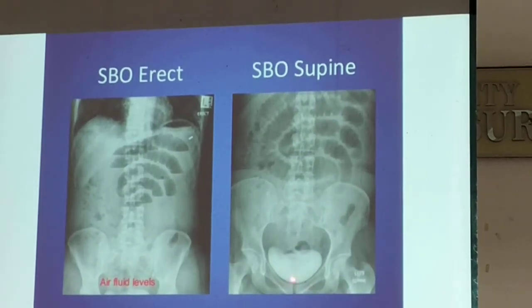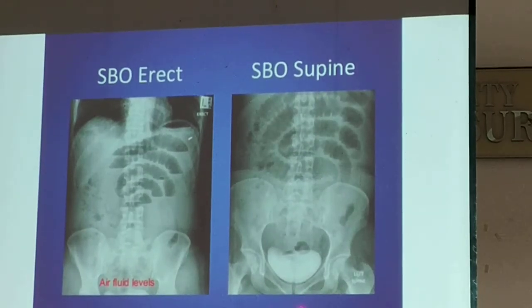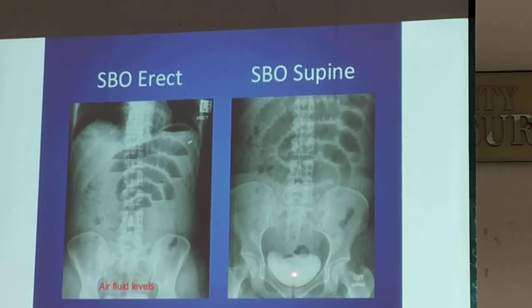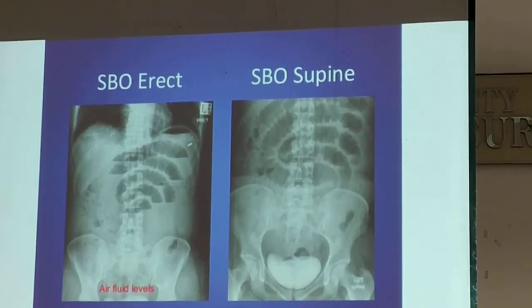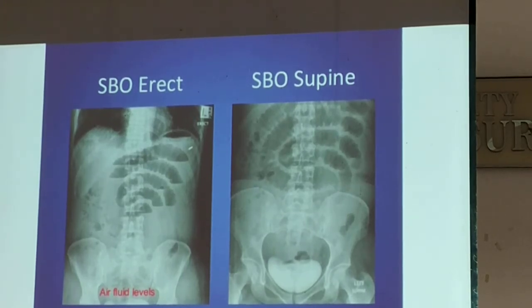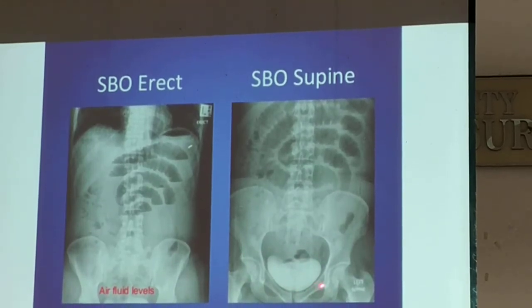Okay? This is a film of your KUB IVP. This is a film of your IVP. Why? The bladder is opacified.